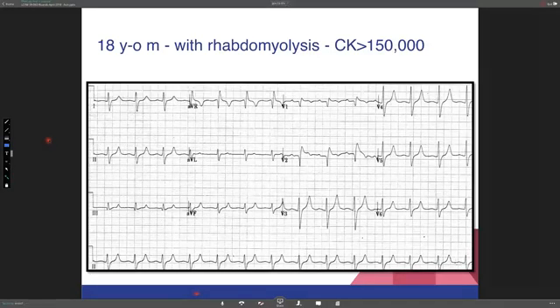So I've seen during my fellowship one case of hyperkalemia-induced Brugada pattern. One case. I can't remember the EKG findings, but it looked like a Brugada pattern EKG type 1. The patient presented to the ER with, I think, hyperkalemia. I can't remember if he had rhabdomyolysis or not. But Brugada pattern, nowadays we get a lot of consults for Brugada pattern EKG, even in the ER for patients who present for different things. And like Khalid mentioned, they put the EKG leads in the third intercostal space and second intercostal space rather than the fourth, and then it looks like almost a Brugada type 2 pattern, and we get consulted for that.